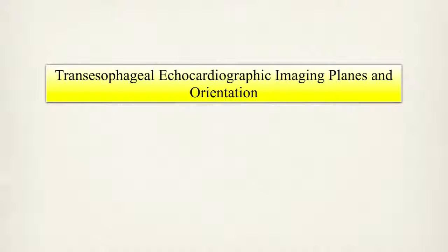In this module, we will review the basics of probe manipulation and also explore how to obtain each echocardiographic view using simulated images to assist in understanding the probe position. This module will serve to solidify your understanding of these complicated and important concepts.